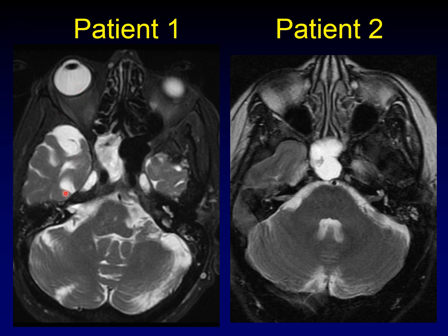One is the effect on the nearby brain. You can see enlargement of cortical sulci near the area of abnormality. Something has gone wrong in the overlying brain. That suggests that this brain is being pulled in, and what we're dealing with here is an encephalocele. Let's look at patient two.